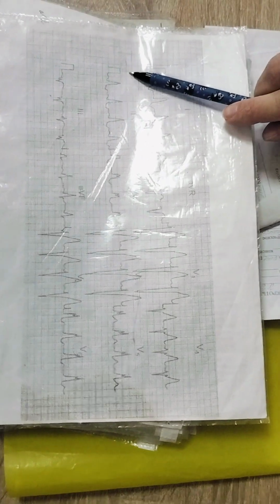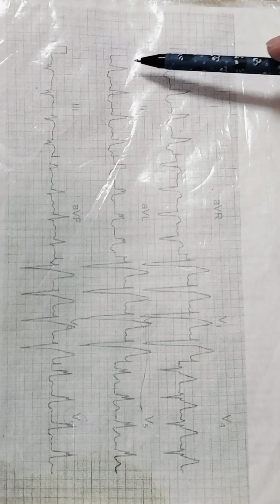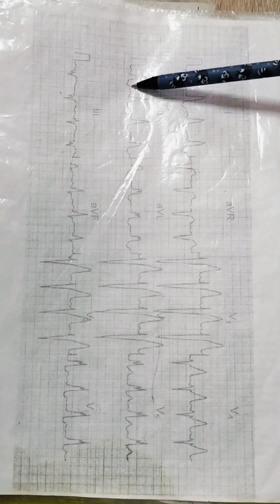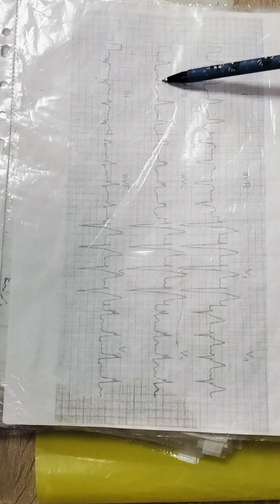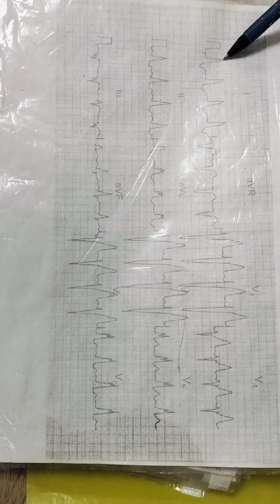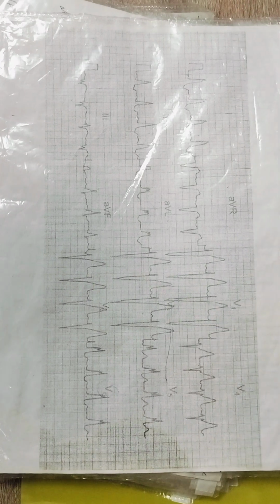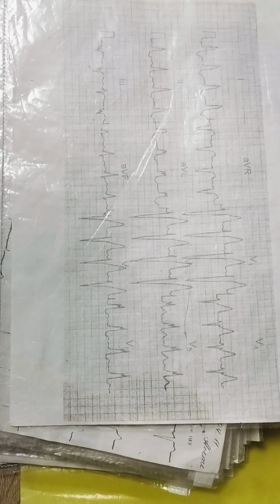Quality is okay. P wave is here. Rhythm is regular, but there is tachycardia. This distance is too short. There is no isoelectric line between T wave and P wave. That's why it is tachycardia. QRS complex is deformed. Something wrong with QRS complex. R wave is doublet. R deep S, R S R wave. So there is conductive problem, which is topic of our last lesson.